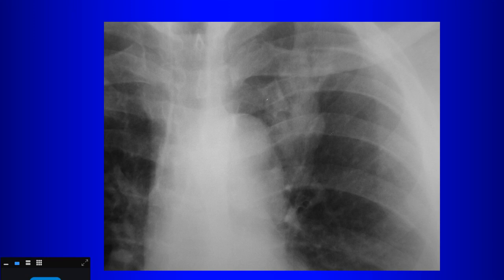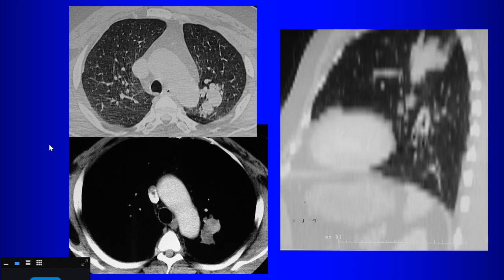Or excuse me, cancer tends to be more aggressive, right? So you want to think of a slow-growing endobronchial tumor, which would be carcinoid, right? So carcinoid can cause mucoid impaction. In this particular case, what's the clue that this patient has an endobronchial tumor?